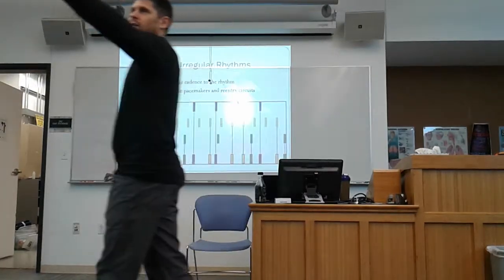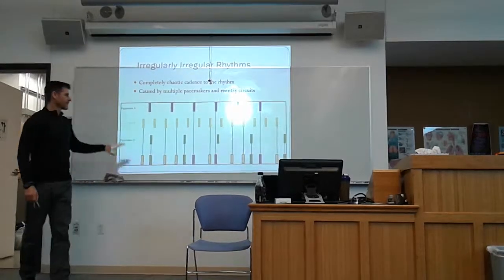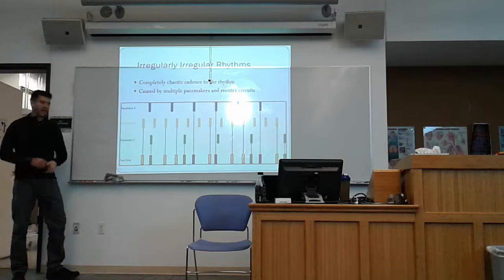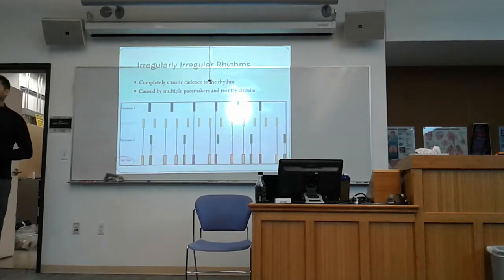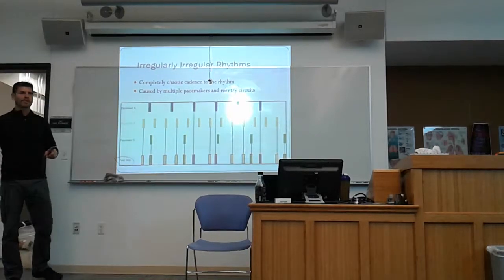You have the question? What is it? On your pacemaker situation, 2 of those are regular. The third one is not. Okay, so here's the deal. This one, where it says final strip, that's what I'm seeing on the monitor. That's what's coming off of my paper. But here's an example of how something like this could happen.